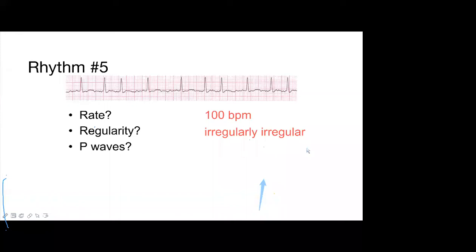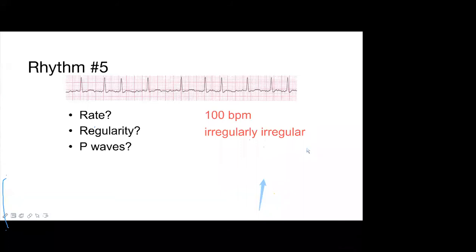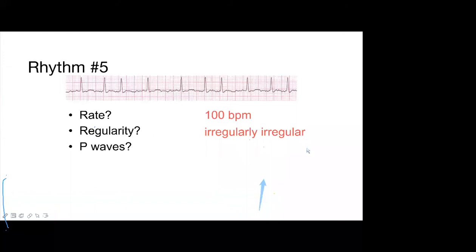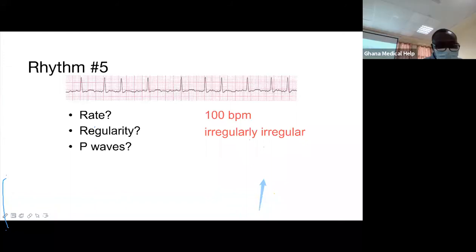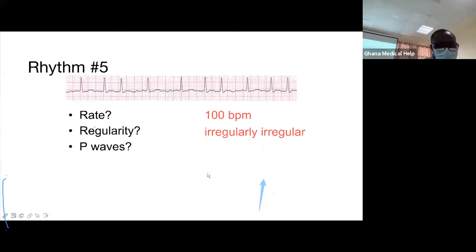Okay, so you think they are P waves, but they are not normal? Yes, please. Okay, fantastic. And you see 2 of them. In the whole of this ECG, you saw two P waves. No, there are 4. There are plenty. 4 that I have seen.